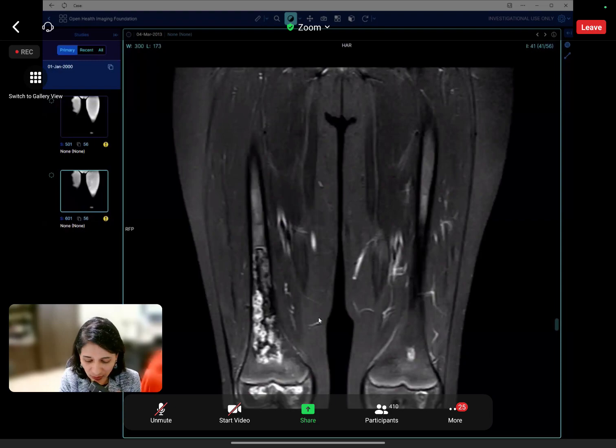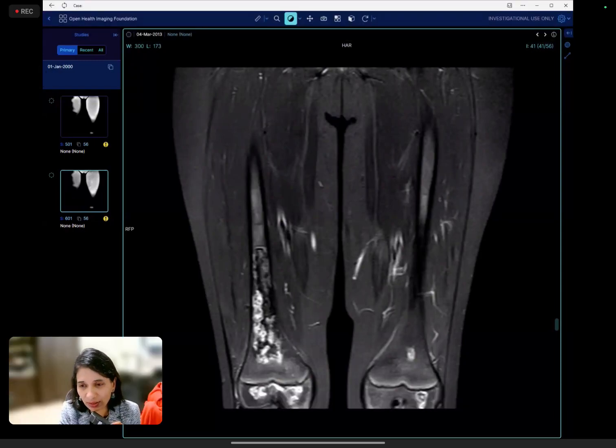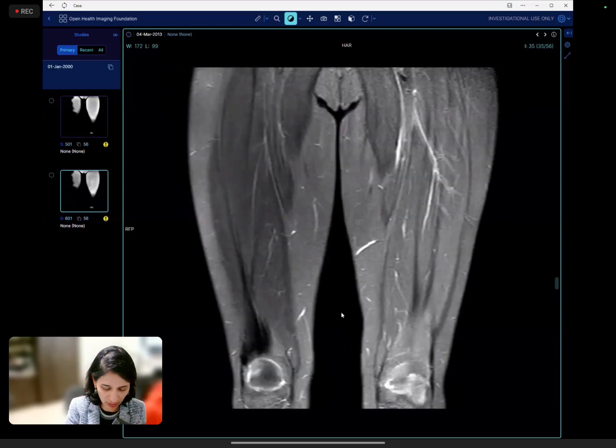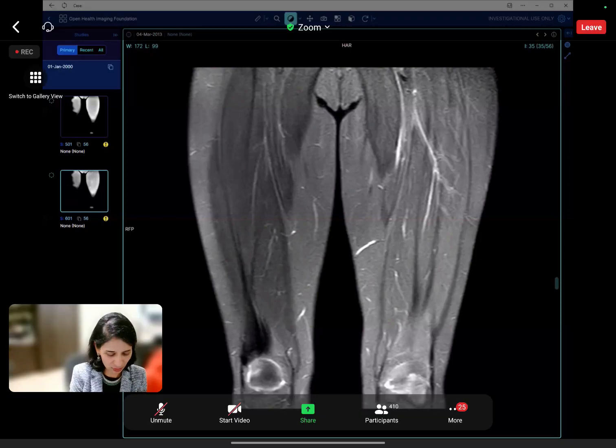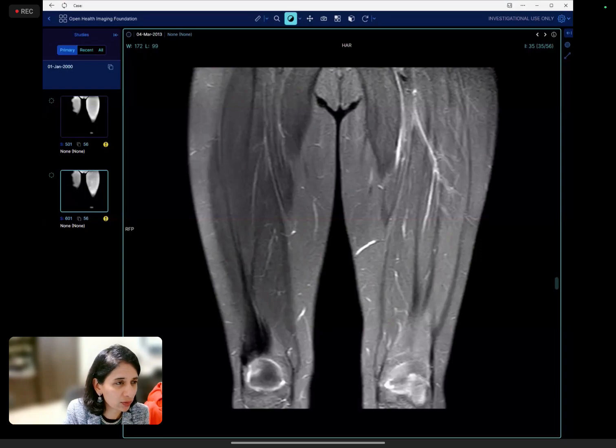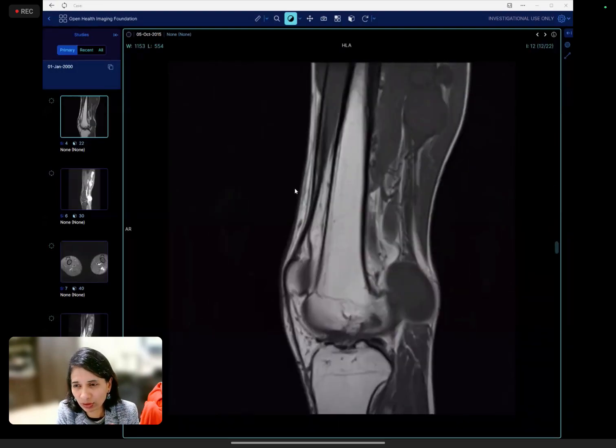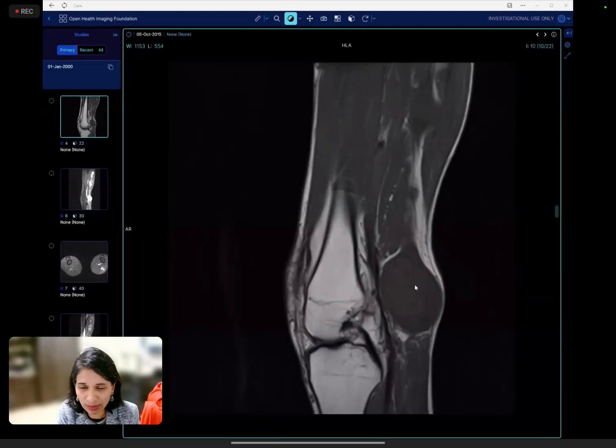But you're right. You gave sickle cell anemia and high dose steroids as the main differential for these changes. Okay, so this is case number 25, so I'll cross that off. And case 5 was schwannomatosis, but I think it's difficult in that case to say exactly whether it's neurofibromatosis or schwannomatosis, because they are both neural based lesions.